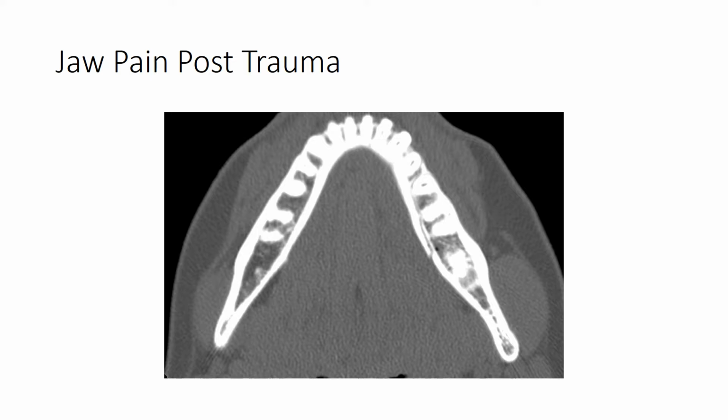Here's an axial section CT in bone windows, not great bone windows, but here's a fracture. So obviously when I show it on one slice, it's obvious. You may think, oh, I wouldn't miss that, or how could I miss that?